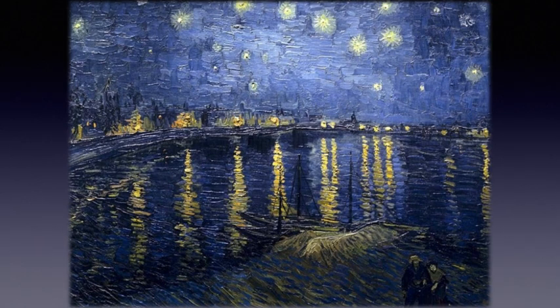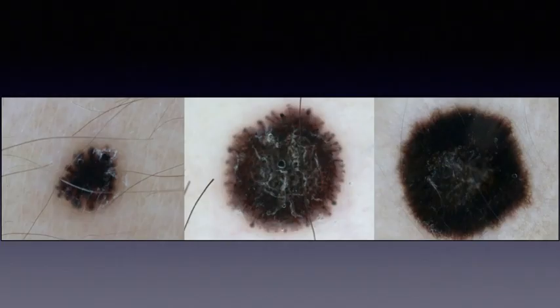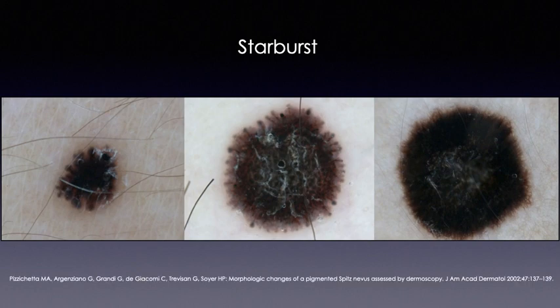The world of spitzoid lesions is really fascinating, and dermoscopy has given a great contribution in the definition of features and also in management recommendations. The starburst pattern, even if it's a metaphorical term, reflects very well the nature of these lesions, which are so explosive in their type of growing and also in their appearance.